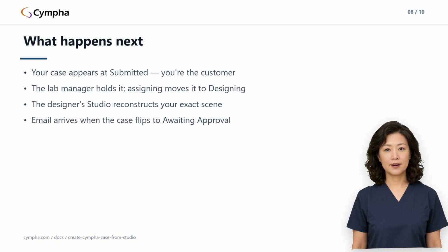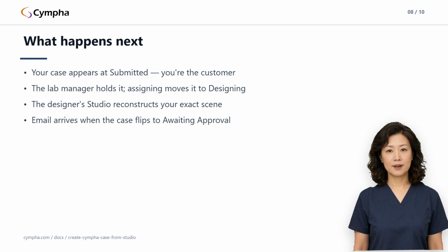After Submit, the case machinery takes over. Your case appears on app.cympha.com with the status submitted. You're the customer, and the lab you picked is the lab. Every submitted case starts in the lab manager's inbox. When the manager assigns it to a designer, it moves to designing.